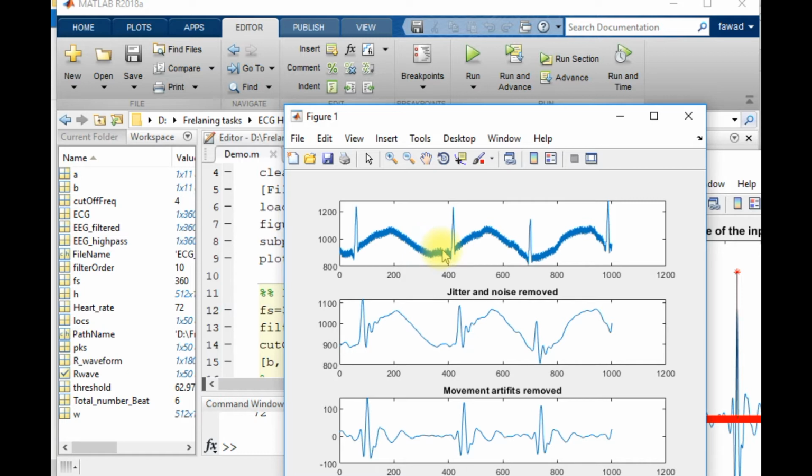These are due to the noise captured by the electrode while collecting the ECG data from the patient. So first of all I have to apply a few filters, low pass and high pass, to remove these sharp and low frequency signals from the data.